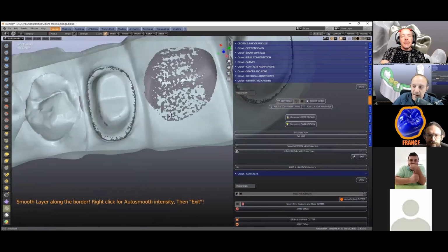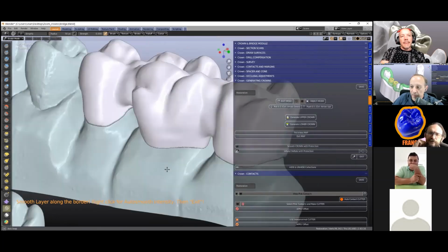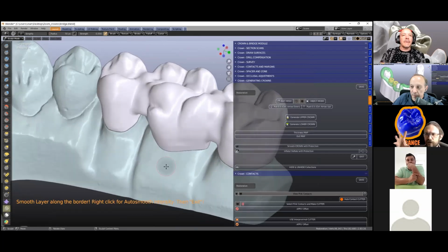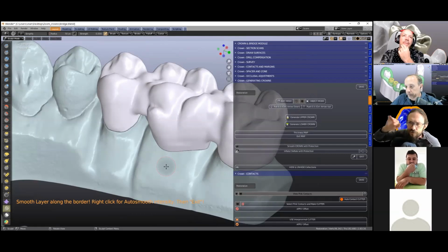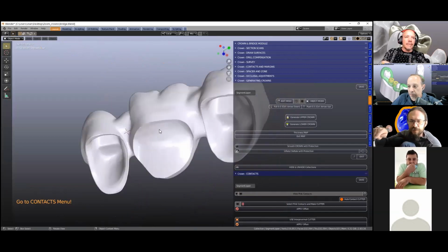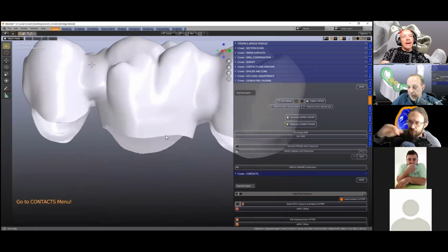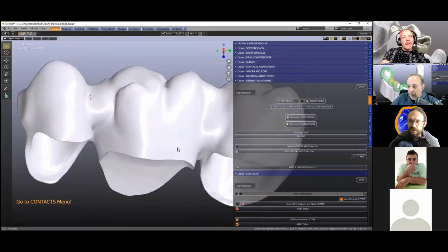Of course, because the gum gives way, so it won't really blanch at a surface to surface contact. You could also remove the masking while sculpting, and you could add or remove or smooth. Even if it is protected, you can remove the protection with the menu there. That would be a good one, but you have to be careful. For the mouth guard, you want to have a rounded edge for the upper parts. When I finish the mouth guard, because now I do triple layers, for the final layer I want to round it. So I use the sculpt mode, the masking sculpt mode. I remove the masking for like 1 or 2 millimeters, and then I round and smooth it. Yeah, it can be possible to do it just like that. It's okay.